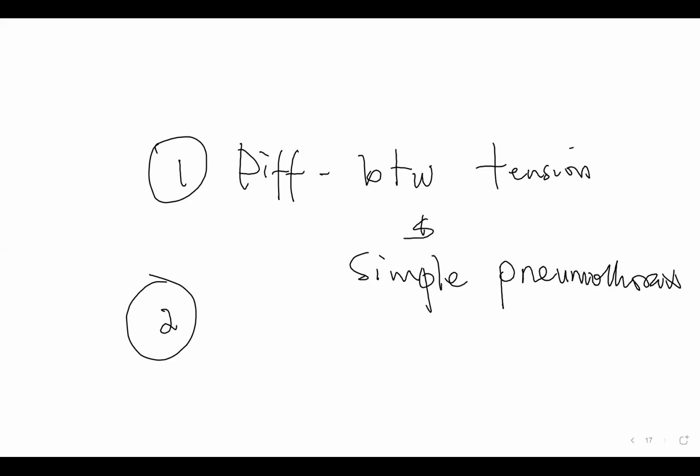These three features are seen in tension pneumothorax. In simple pneumothorax, you just see radiolucency and reduction of the lung size. When you look at the vascular markings, there is a reduction, and you see an area of radiolucency. Hope that is clear.